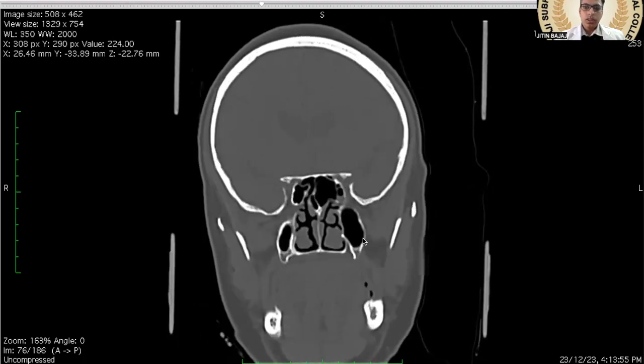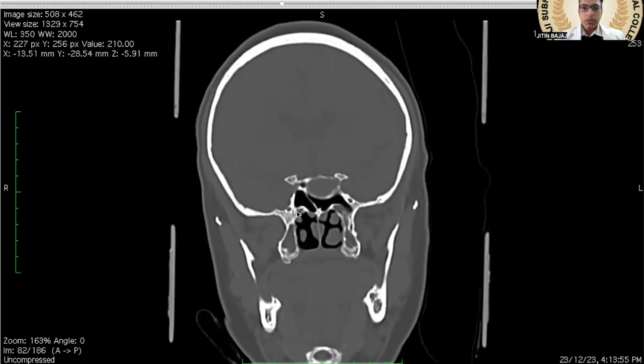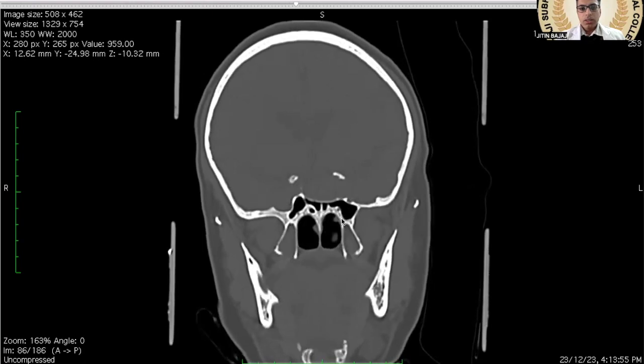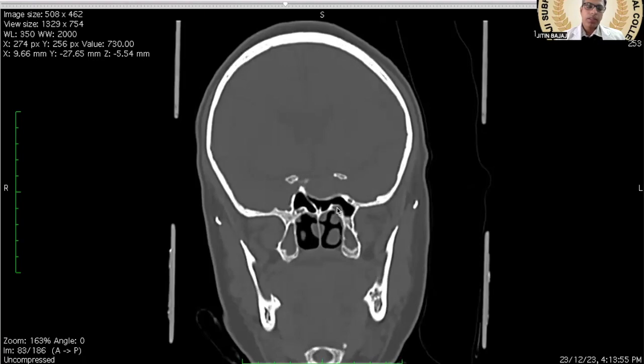So in the floor of the sphenoid sinus, there will be the area for the Vidian canal. The Vidian canal comes anteriorly from the pterygopalatine ganglion. So this is the Vidian canal, and this actually has clinical importance because this marks the level for the internal carotid artery. So whenever we are not having the navigation, we can just make a guess based on the Vidian canal. This is the area for the maxillary nerve.